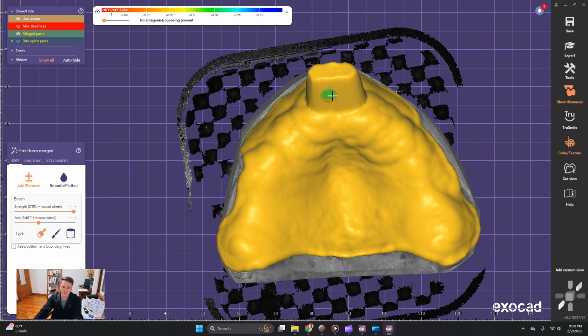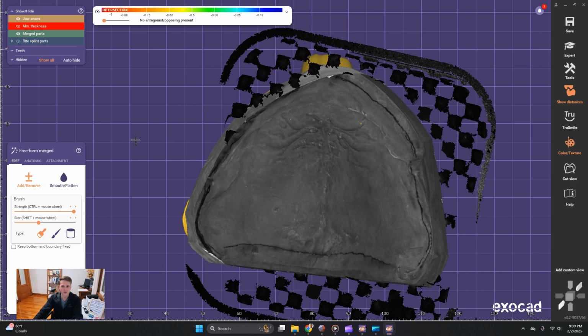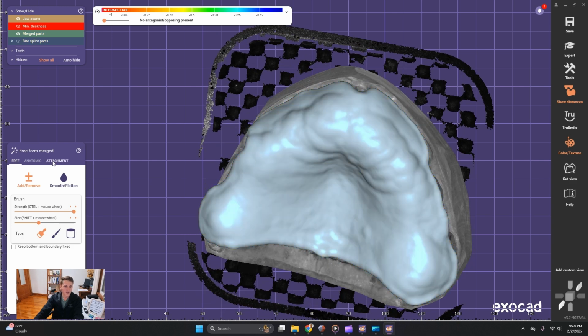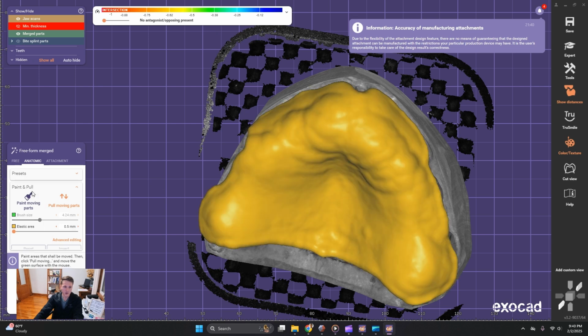and if it was for a fourth year and they didn't want this, you would just subtract the handle, and you would just take out these little tissue stops. Especially for Dr. Quinn. If you're making a custom tray for him, the best way: he doesn't like a handle, but he just likes a little nub.